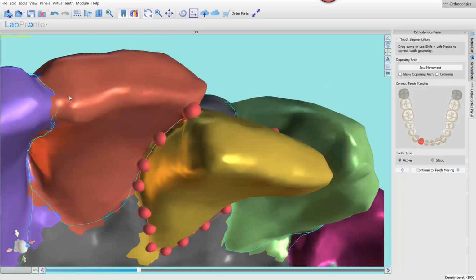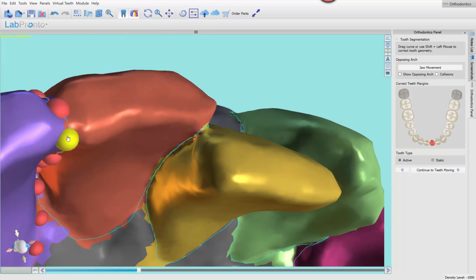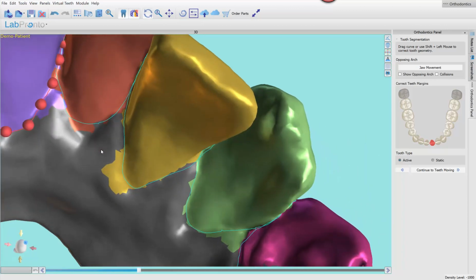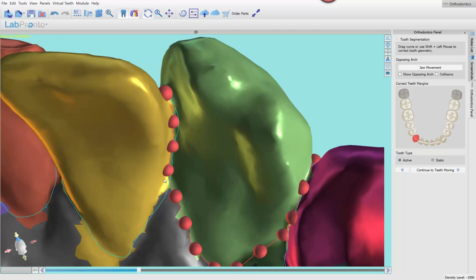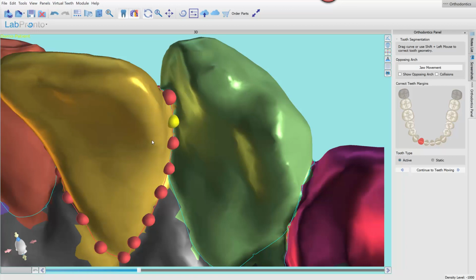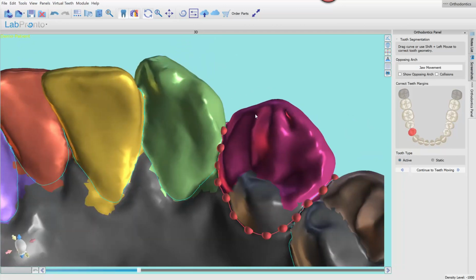Right here as well, I can see these lines are disappearing, so let's make them not disappear. There we go. This is one of the areas in active development to help reduce the time this workflow requires. And lastly, see how crowded these teeth are. As I was saying before, the more crowded they are, the more of this there is, because it's a smooth transition here, and the software's like, okay, where do you want me to put the line? And it just guesses, and so we need to go back and edit it.